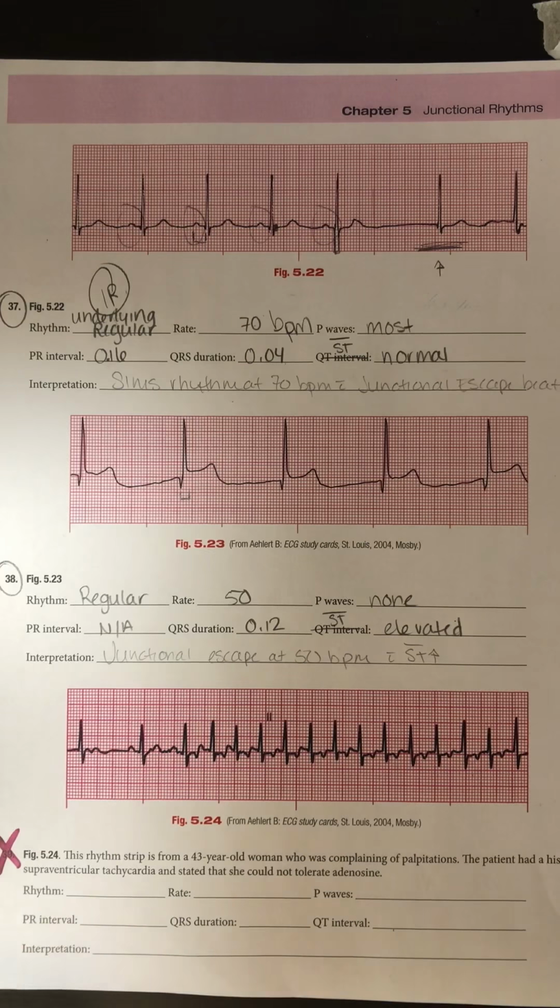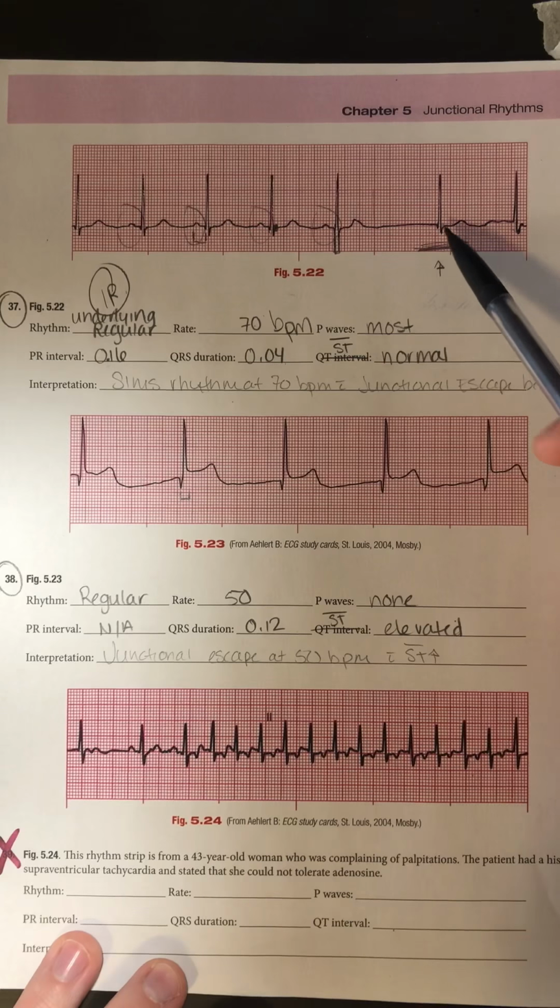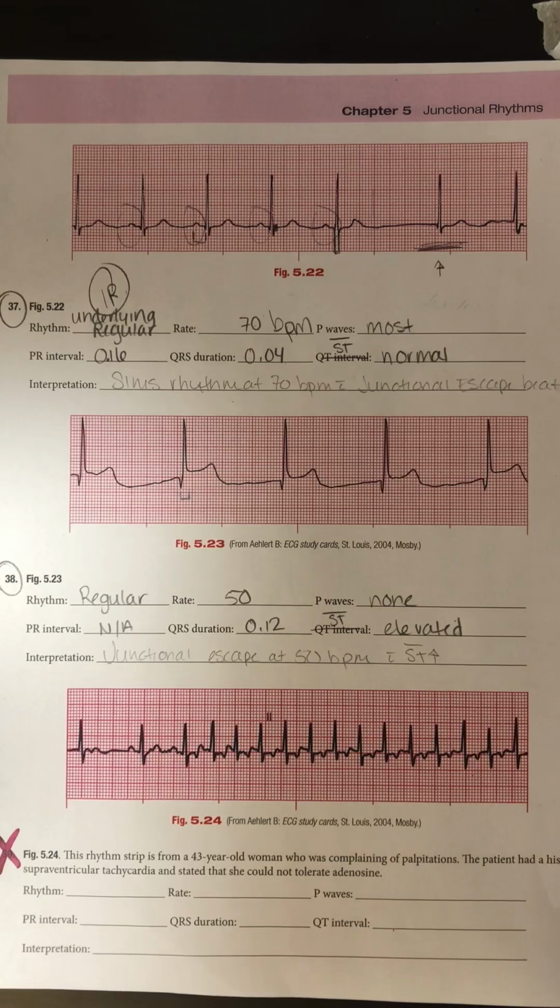And what's happening here is that my SA node's firing off at 70 beats per minute, and then all of a sudden it just decides to take a break for whatever reason. My SA node just stops firing off. So once that happens, we have a fallback mechanism where it falls back to the next node, which would be my AV node. So that AV node begins to kick on, so we keep a heart rate going, and we call that a junctional escape beat. And usually that'll trigger the SA node to start firing again. So usually we only see one. We could see the patient transfer into a junctional rhythm, but usually we only see 1 or 2 beats, and then the sinus mechanisms begin picking up again.